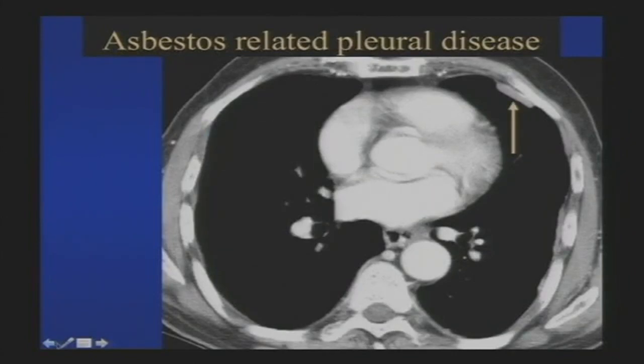So one side was nice and well-defined. The opposite side was very ill-defined. Again, very typical pleural lesions, things in the lung, well-defined all the way around. And that was someone with pleural plaques, an asbestos-related pleural disease.